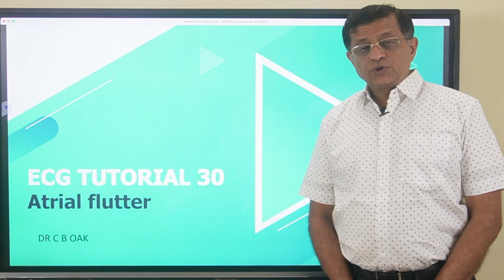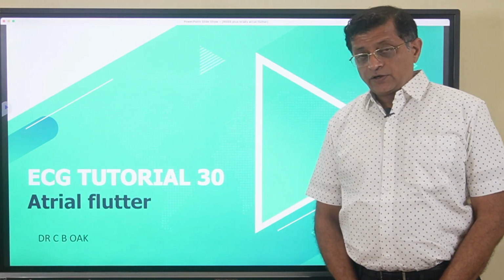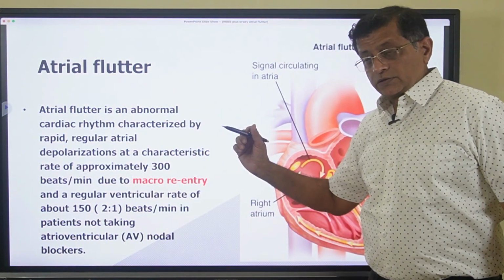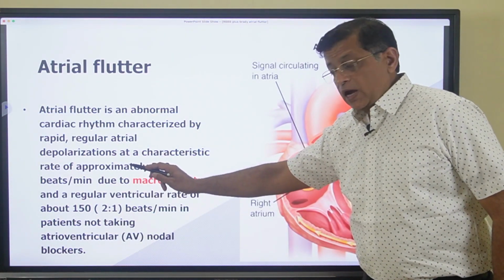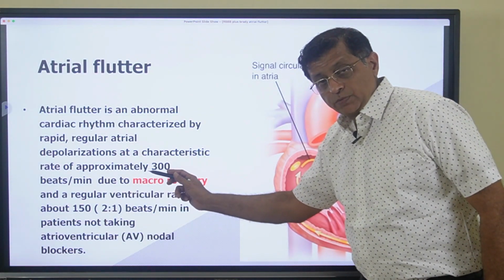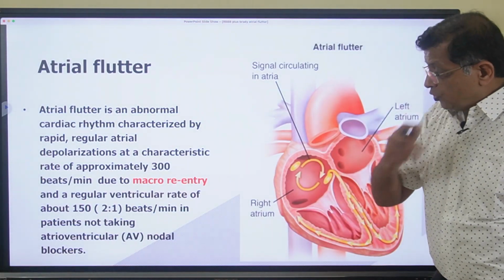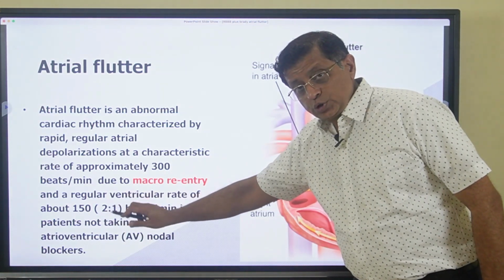This is the 30th ECG tutorial, and the topic of today's ECG tutorial is atrial flutter. So let's begin. Atrial flutter is an abnormal cardiac rhythm characterized by rapid, regular atrial depolarizations at a rate characteristically around 300 per minute, maybe more than 250, and due to macro re-entry with a ventricular rate of about 150, that is AV conduction of 2:1.